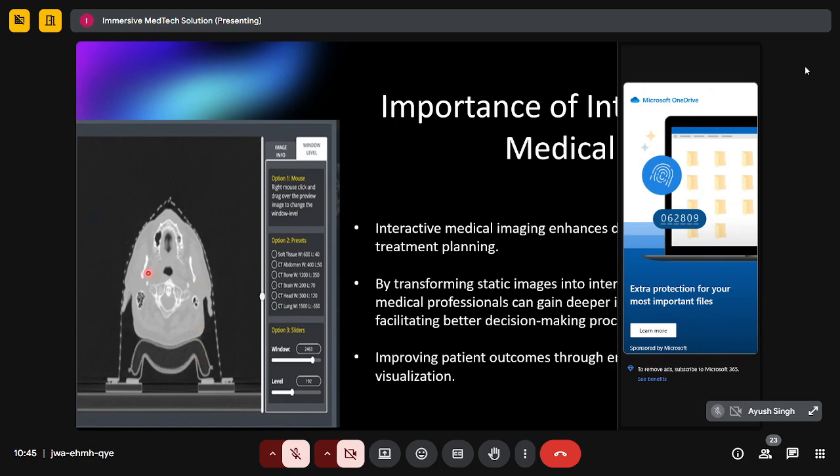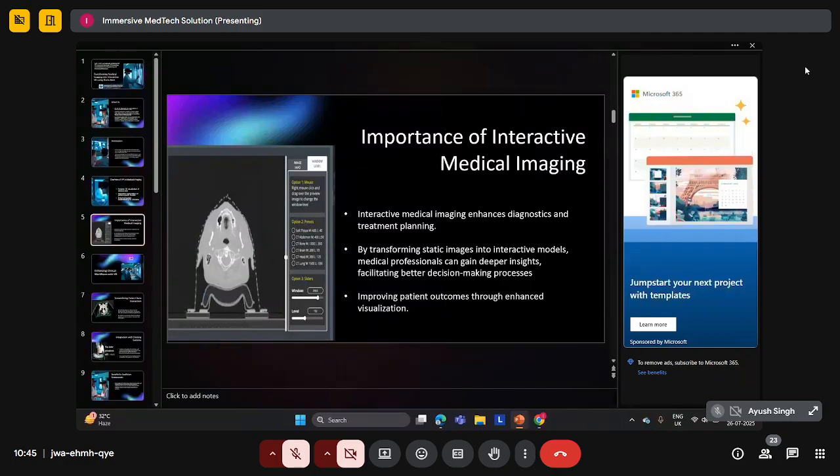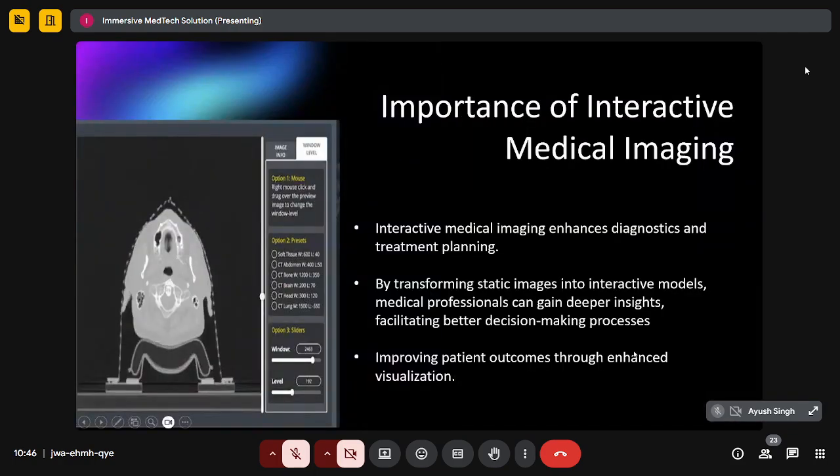Since this is shown in 2D, the data set is not that clear, but once we go into the 3D view in the virtual environment, the data gives us more clarity, and ultimately we have proper decision making. And even if we are developing any new CAD implant, we can have a precision of around 0.001 millimeters. The models that are prepared are highly defined models, and we are also given an option to design our own sets of designs directly here. So that further helps us in our task.